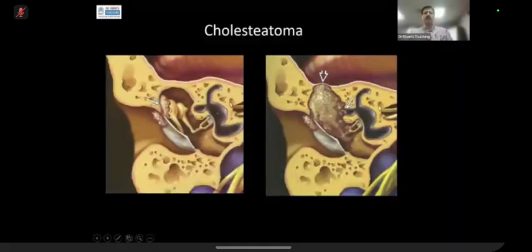And many times the clinicians tell us, I can see a cholesteatoma, please see what is happening inside. Tell me the roadmap, what to expect when I'm going in. So this is a classical pars flaccida cholesteatoma. And gradually it will erode this scutum. This is in the Prussak space. And it will erode this ossicle.